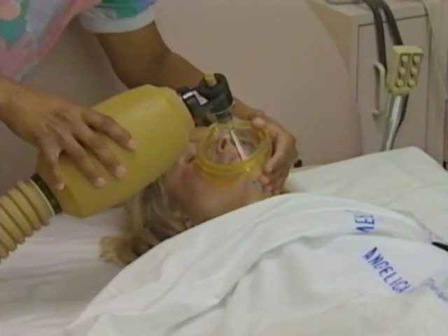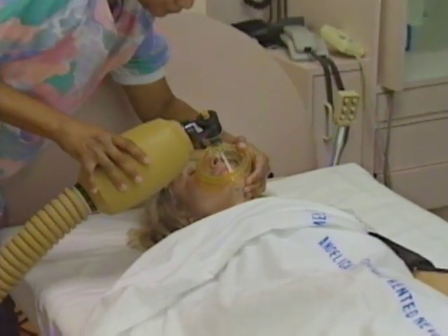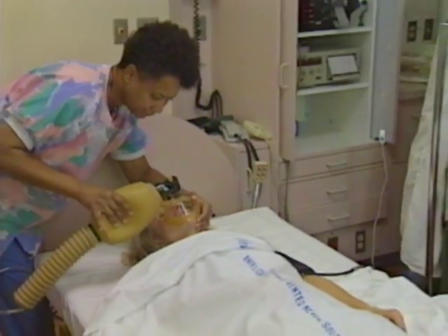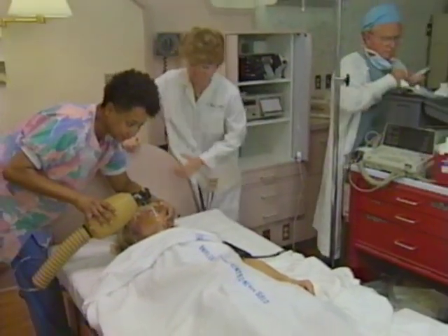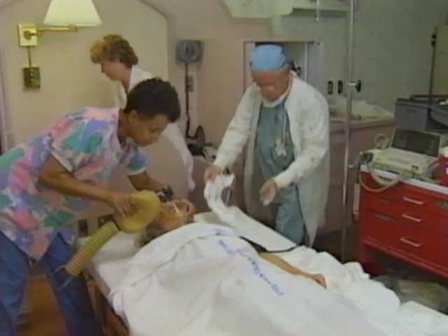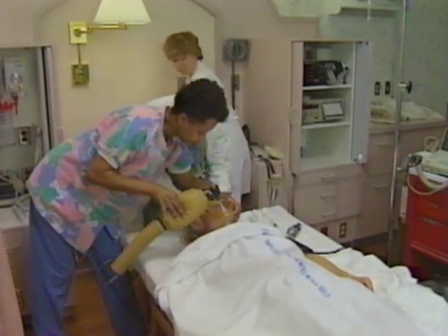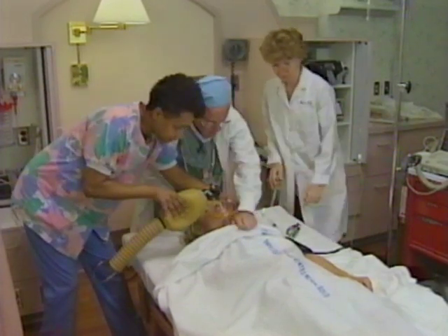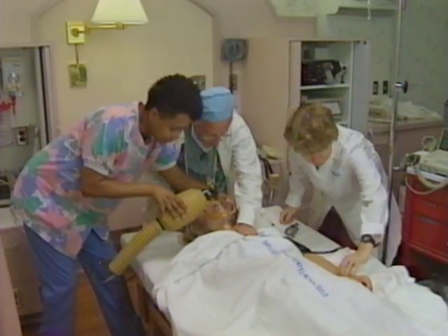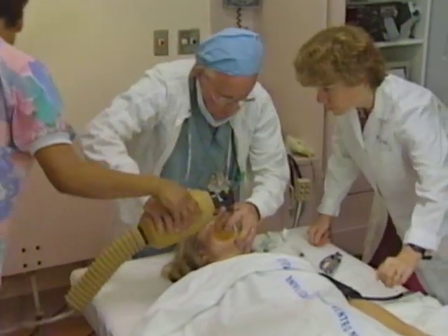It's safe to stop ventilating the patient when he or she has an adequate tidal volume and respiratory rate to maintain good oxygenation and ventilation. Patients will often tolerate an oral or nasal airway fairly well until they're awake enough to hold their own airway open. It's easier to leave it in place until then, rather than remove it too soon and try to put one back into a semi-conscious patient who might fight you.